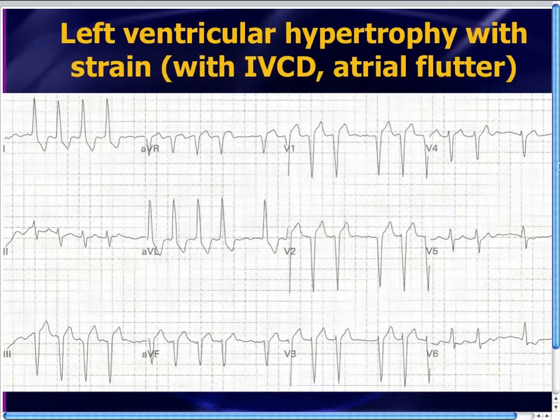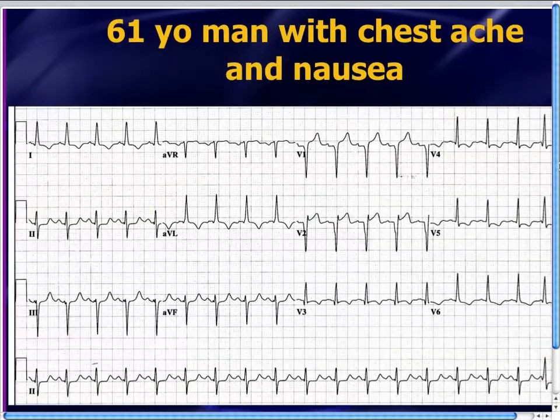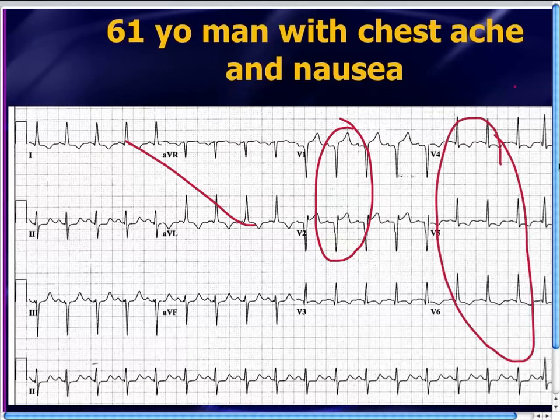Here's another 12 lead. And this actually resulted in activation of the cath lab, which turned out to be a false positive cath, clean coronaries. But it looks like there's a septal STEMI. There's some flipped T waves and ST depression out laterally. So it would be very easy to call this a septal STEMI with lateral reciprocal changes. This turned out to be purely LVH with strain. When in doubt, don't hesitate to call cardiology with these type of cases.